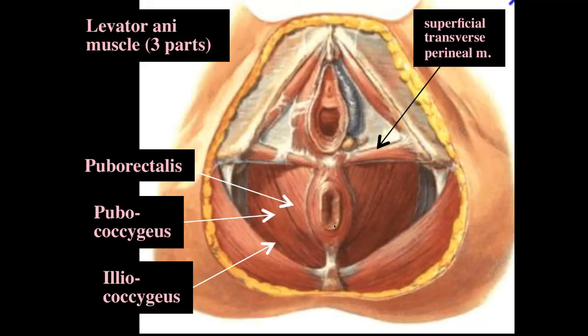So when we look at the floor of the pelvis, it's really using 3D. 3D is extremely important to do this examination. It's only after 3D that I realized how easily ultrasound can lend itself to doing this. Because with 3D, as I'll show you in a moment, you can actually look at the floor of the pelvis from below, en face, if you will. And these are the components that we look at.